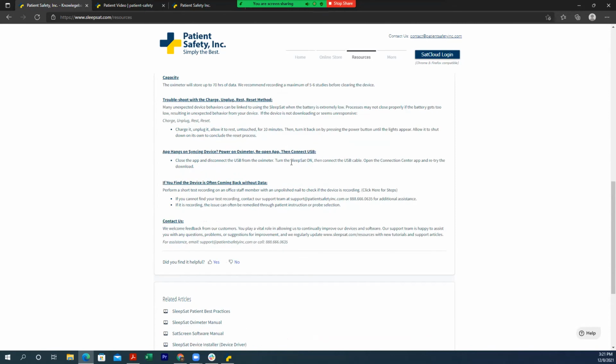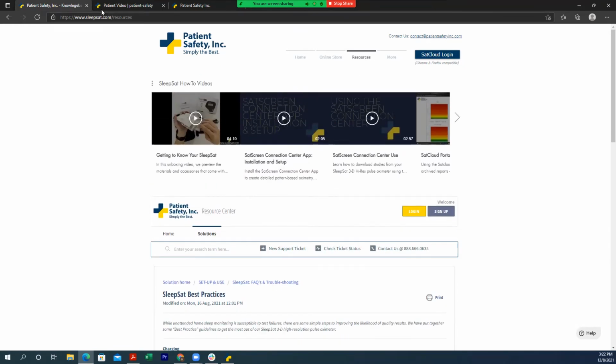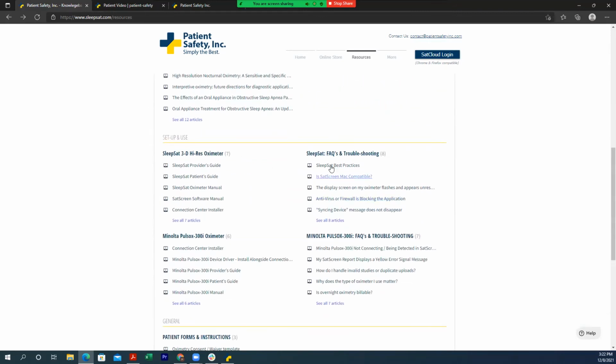There is some other troubleshooting in this best practices document. I do recommend going through it. Again, that can be found if I come back here to the main page. It can be found under the SleepSat FAQ and troubleshooting option right here at the top, SleepSat best practices.